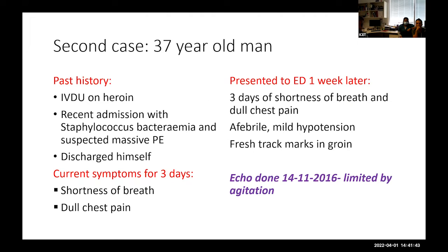Now we're going to go to some cases. So what I'm going to get one of you to do is to come and run the show so that you go through the images at your own pace. You up for it, Ben? Yeah, of course.